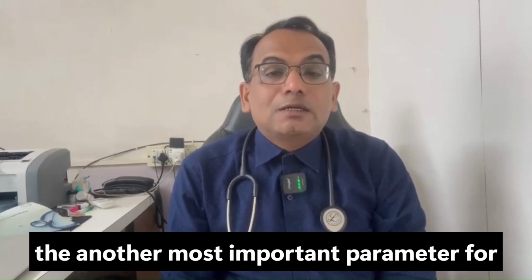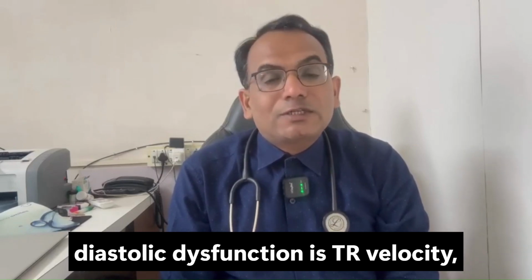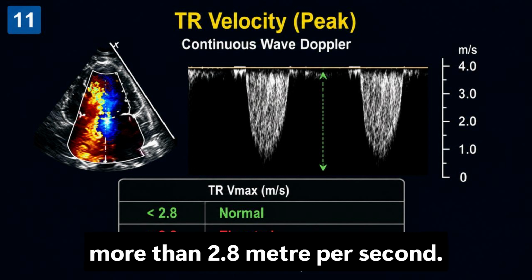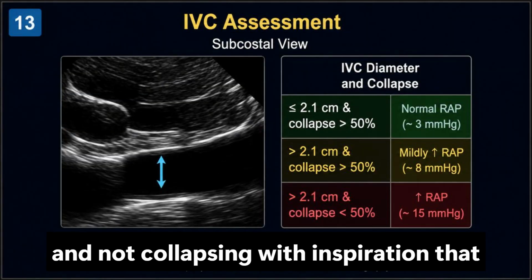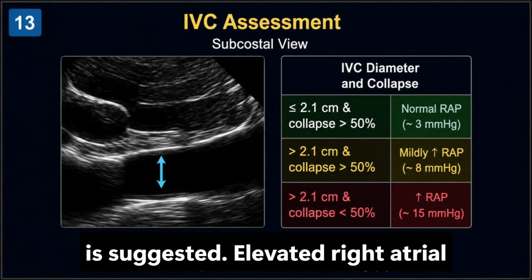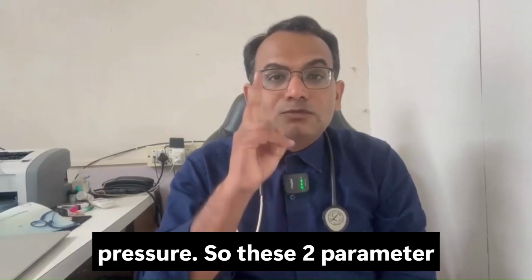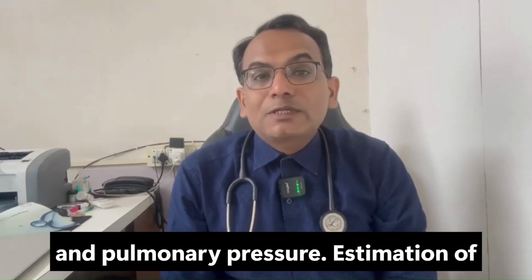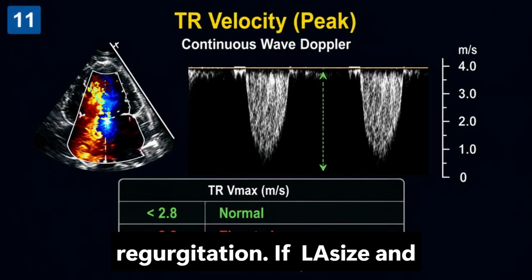Second, another most important parameter for diastolic dysfunction is TR velocity, tricuspid regurgitation velocity. If TR velocity is more than 2.8 meter per second, and simultaneously if IVC is dilated and not collapsing with inspiration, that's suggestive of elevated right atrial pressure. So these two parameters are most important: LA size and pulmonary pressure, estimation of pulmonary pressure by tricuspid regurgitation.